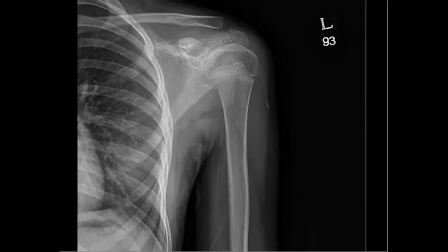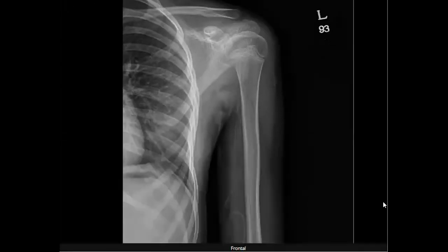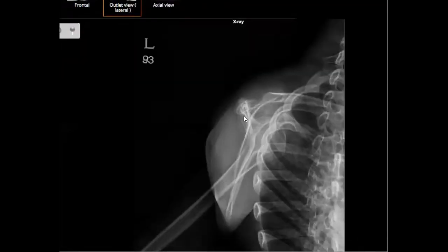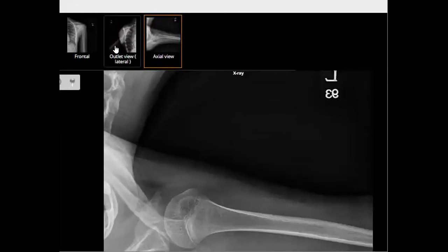Exactly, it is in the scapula here. You cannot see the lateral border of the scapula, right? Maybe you can see some periosteal reaction here, then after that it disappears. So this is what is called an aggressive moth-eaten, destructive pattern of the scapula. Ewing sarcoma again is very tricky in the exam, so take care. This is the Y view, and I think it is again not easily detectable. There is something missing in the Y appearance.